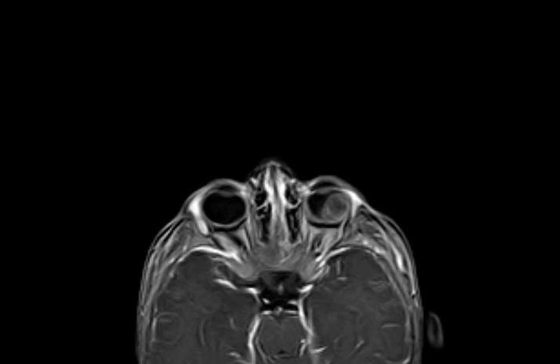On the ultrasound, he had a mass with some internal vascularity. So it's not, for example, a cyst or bleeding or abscess or whatever, okay? It is a soft tissue mass. In this case, it is definitely retinoblastoma. Whether you do CT or not, it will just be complementary, okay?